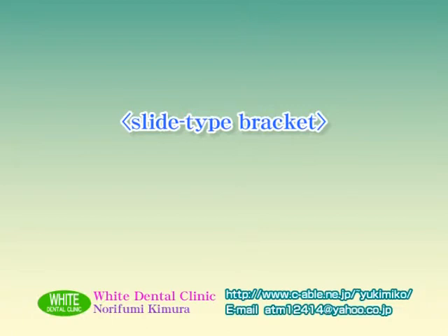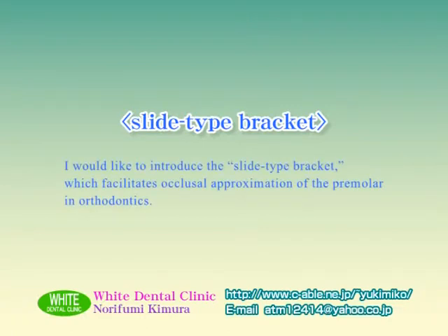Slide type bracket. I would like to introduce the slide type bracket, which facilitates occlusal approximation of the premolar in orthodontics.